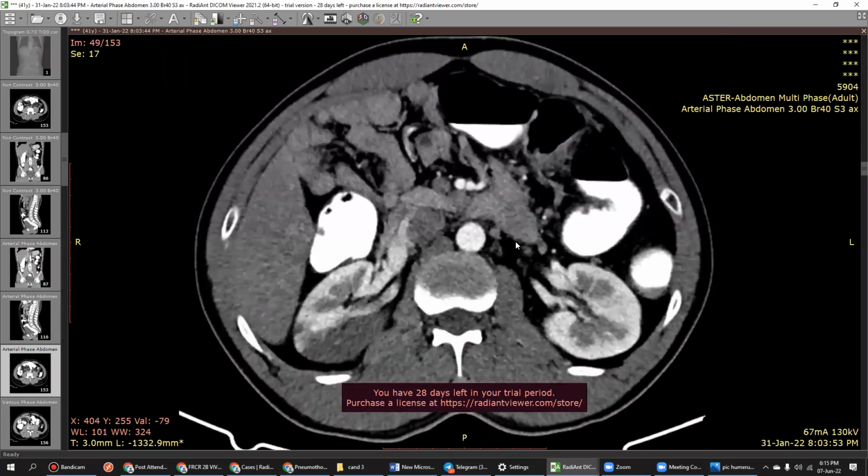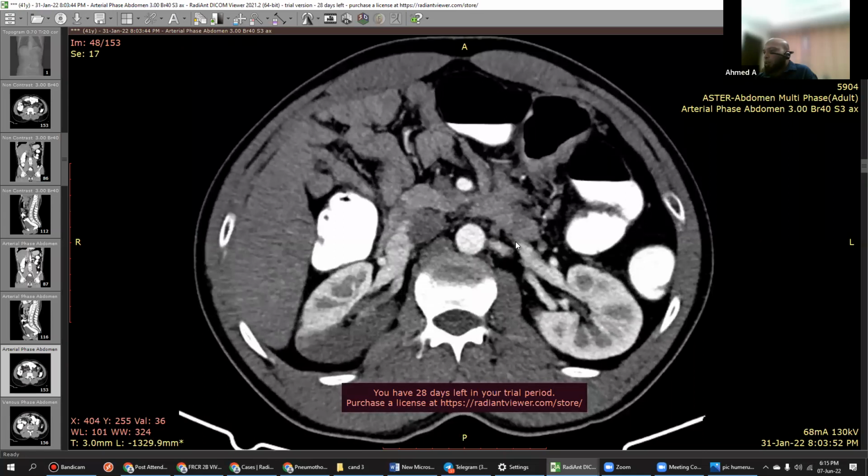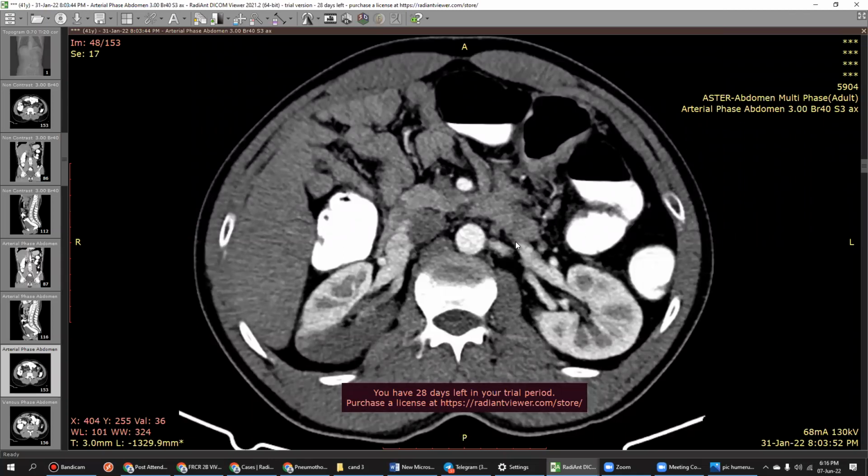It is an enhancing area of cortex under the capsule, because of obstruction of the main supply to this infarcted area. On the other hand, pyelonephritis will be striated and not look like that.